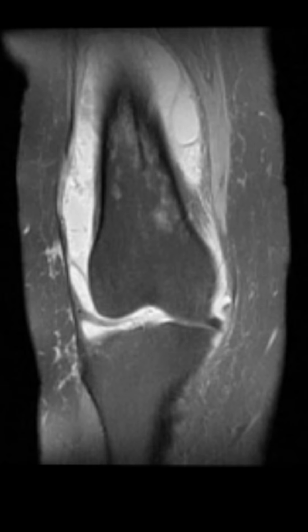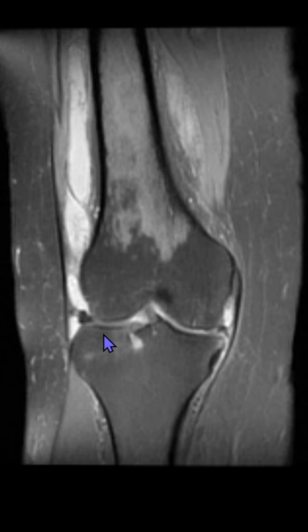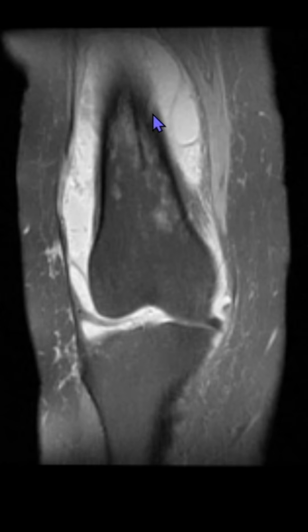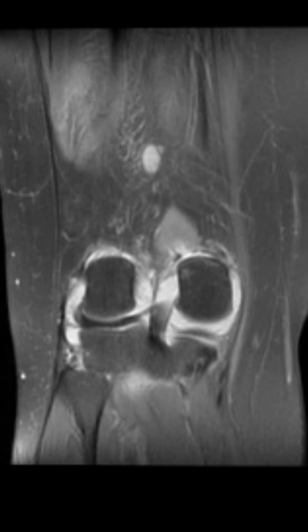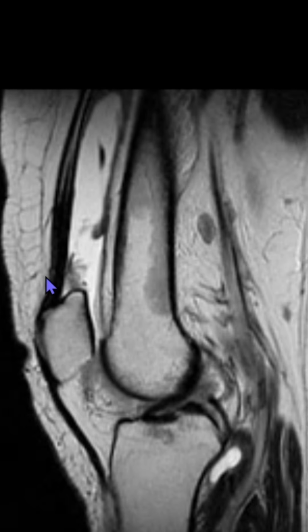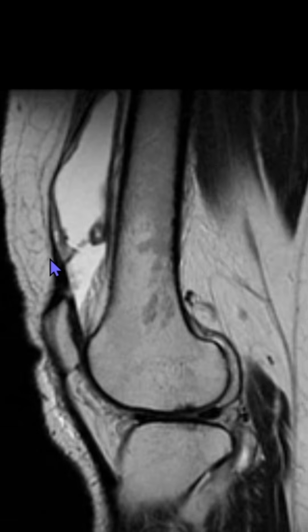So here we have got gross fluid in the knee joint. There is this significant effusion with synovial thickening, and we are seeing this proliferation of the synovium on the PDFS images, and we also see that there are some degenerative changes along with it. The best sequence which will help us know what kind of synovitis it is, or where the synovial thickening is most prominent, is the T2 weighted images.